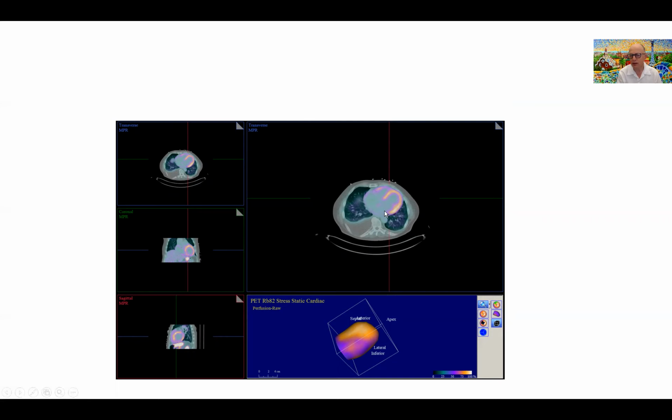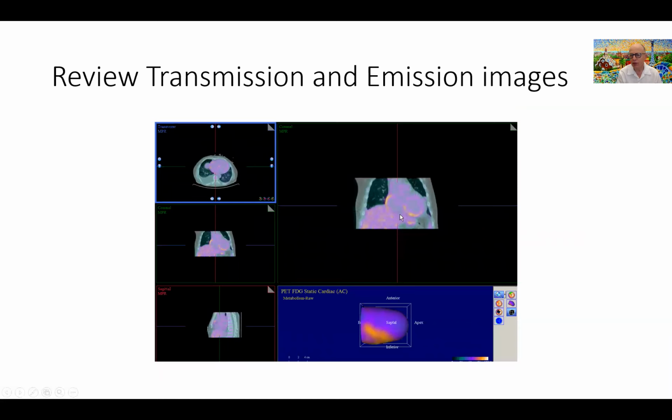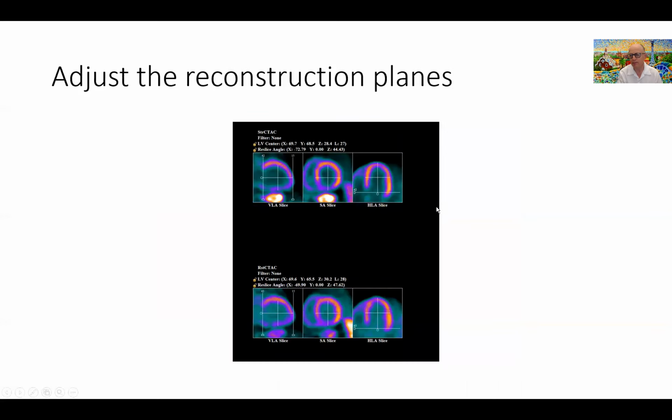No issues with that. And finally, we go through the same process for the co-registration of the FDG images with the heart. So we have the FDG metabolic images here registering with the heart. And you can see here the liver uptake with the FDG, as well as an uptake in the pericardium here, identifying a small pericardial effusion that the patient had.